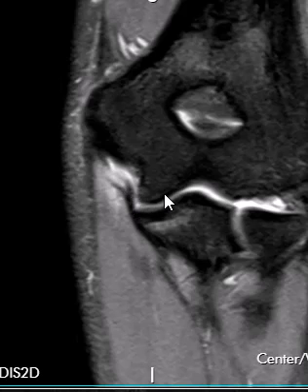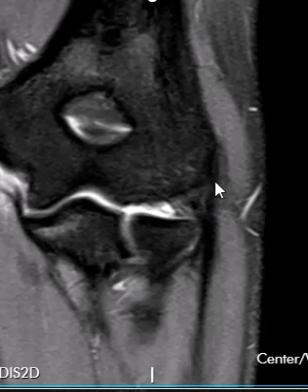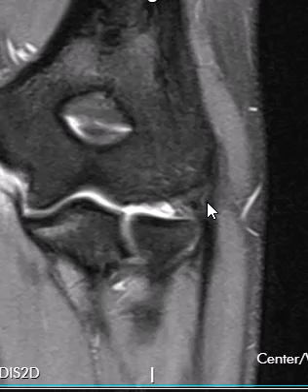The difference between the anterior and posterior bands and the sublime tubercle, these three areas to think about in the UCL. And then the outside, the lateral ulnar collateral and radial collateral ligaments over here. This whole area is nice and dark and uniform, so that is good over there.